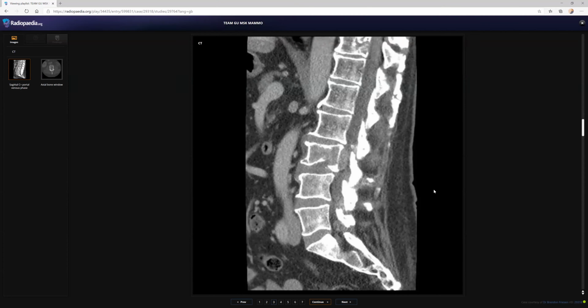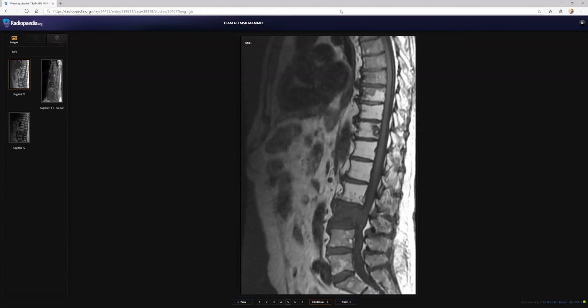So there is a fracture involving this L3 vertebra with a paraspinal component. Most likely there is some paraspinal soft tissue density that I can see on this bone window. So there is impingement of the spinal canal. If the patient is presenting with neurological symptoms like paresthesia and limb dysfunction, it is an acute emergency and should be referred to neurosurgery for these findings. An MRI should be done for further evaluation of the soft tissue component and spinal cord.